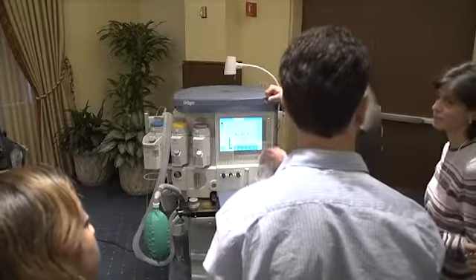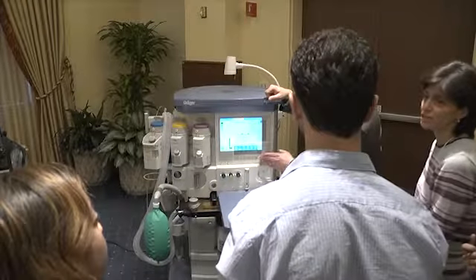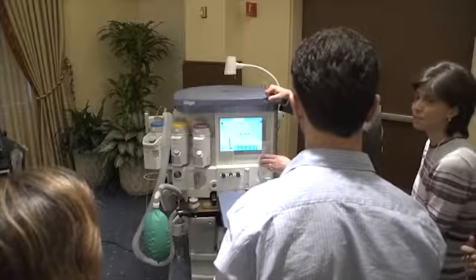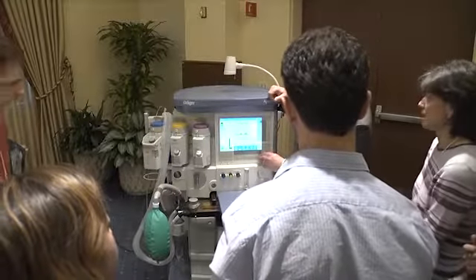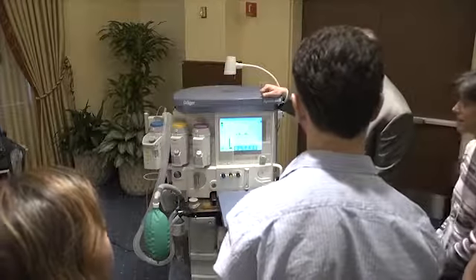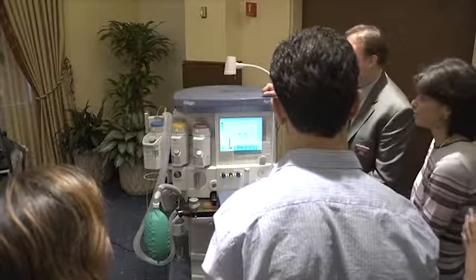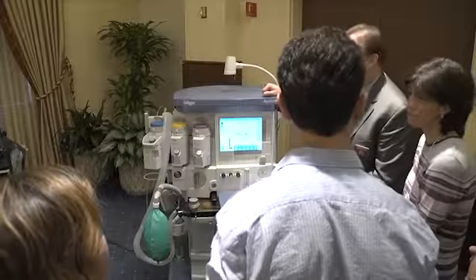If the patient is under light anesthesia, you may need to administer more muscle relaxant. Surgeons may be doing something, packing the abdomen, pushing the lungs up. You change position from supine, and that may change lung compliance. All those things would have to be taken into consideration. Once you silence the alarm, you'll have to do something about it. The idea is that you don't want to continue to maintain high peak airway pressures, number one. Number two, you cannot deliver the set tidal volume, so you may end up hypoventilating that patient.